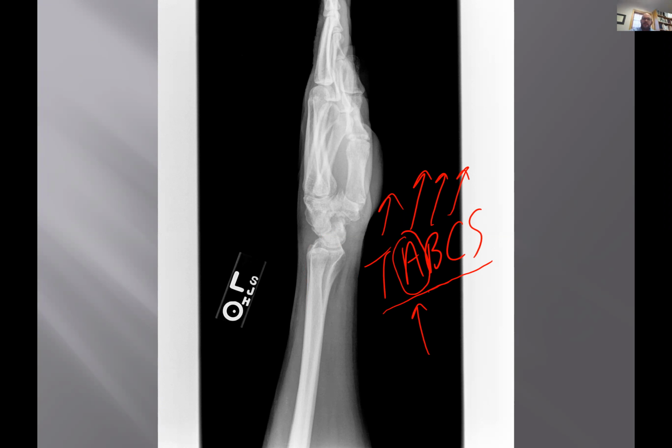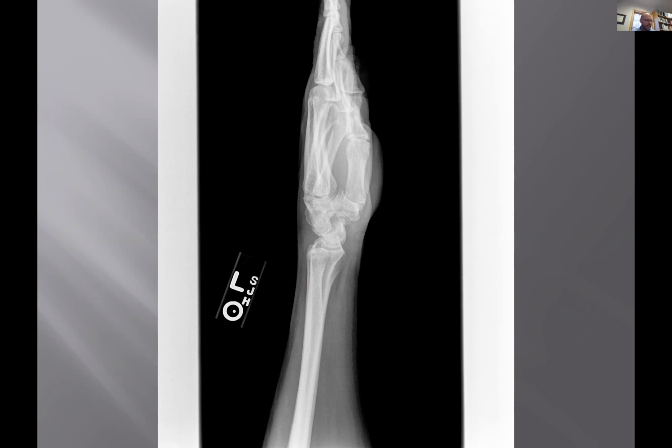And just to remind you, there's a lot going on here: degeneration and alignment problems and widening of this and all the pi signs. So, pretty nice case of scapholunate joint widening, scapholunate dissociation with a DISI instability pattern with nasty degeneration of the trapezium scaphoid articulation. And you know what the ironic part is? And maybe it's not ironic to you. You guys are in practice. You know what hurts here? The degeneration. The other stuff is chronic and it wasn't causing a lot of clinical symptoms.